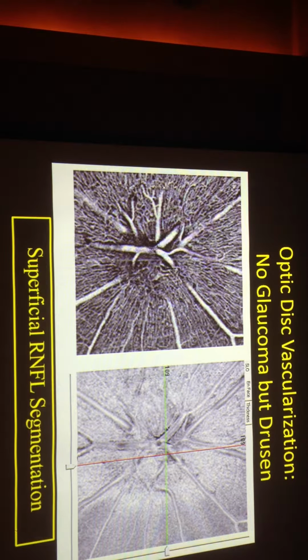And so when you see the excavation of the optic nerve, we probably understand that the vessels have some damage just for mechanical reasons, just on the border of the disc. And so we try to follow what the feeding vessels of this are, and it's very difficult. We don't see very clearly where the nourishing vessel for this little network is. It doesn't seem to be directly connected with the big vessels of the optic nerve. And so probably we have a peripheral connection to give fluid to this network.